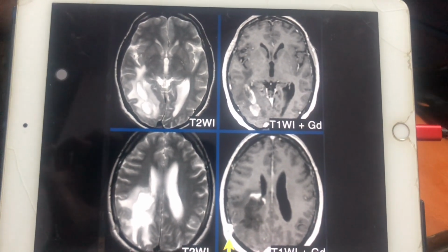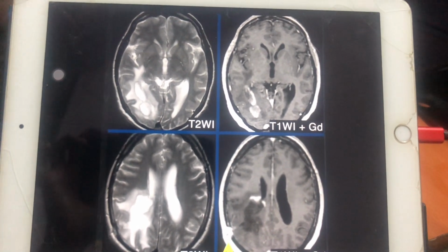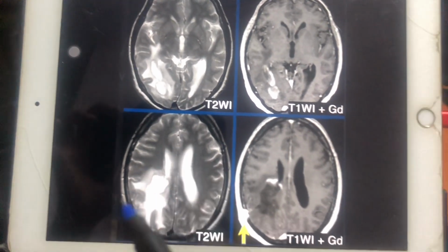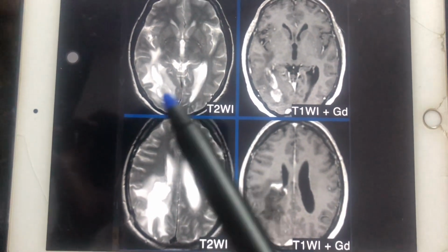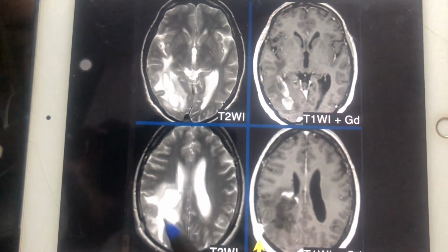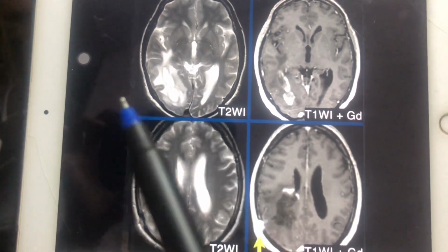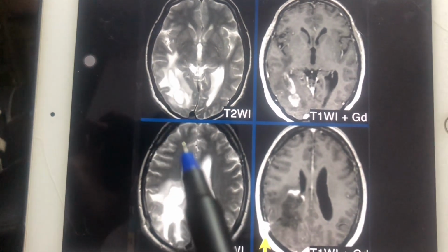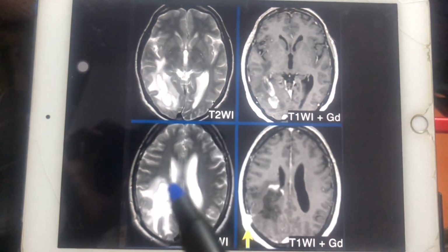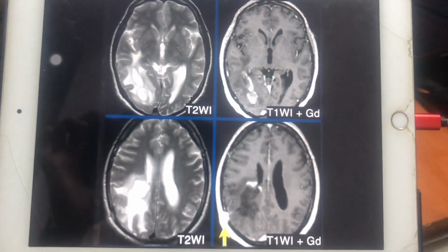Another condition that we have to differentiate from MS, which is involving the brain, is tumor. It's a brain tumor. Okay. So here you have this obvious T2 hyperintense lesion involving the temporal lobe and probably some of the occipital lobe as well, the parieto-temporal and the occipital lobe, right? So there is some perifocal edema also, and this is a T2 weighted image, and this is the post contrast image. Okay, this is at one level cranial to this, and again this is the corresponding contrast enhanced images.